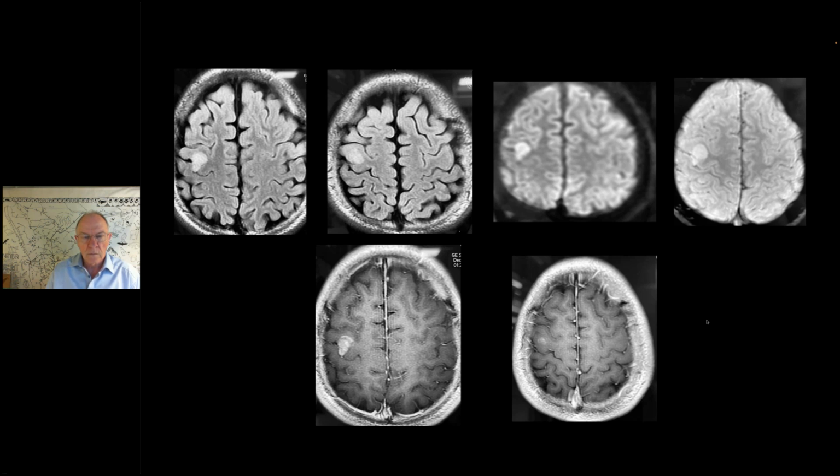What are the imaging differences between a low-grade glioma and a DNET? DNET will have a more cystic appearance. It will probably resemble that of CSF on the FLAIR images, and T2 will be hyperintense. And it is more in the cortex than the subcortical region, more a bubbly type of appearance, rather than here, where it is more of a uniform hyperintensity. And you would say there is some contrast enhancement, right? Yeah. Contrast can be there also on DNET. And the diffusion restriction is the thing which is more in favor of astrocytoma, right? Yeah.